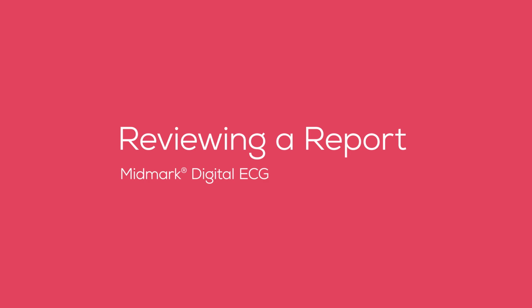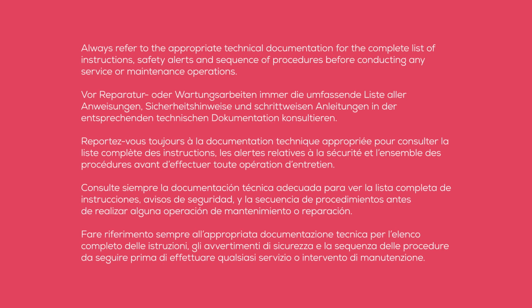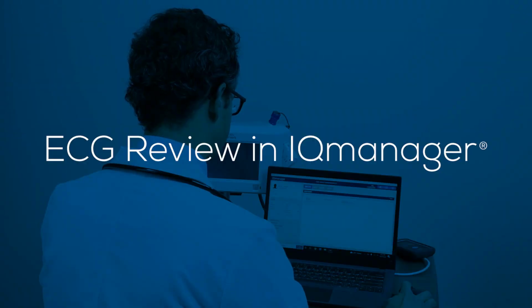This video is an overview of reviewing a report with the Midmark digital ECG. Always refer to the appropriate technical documentation with a complete list of instructions, safety alerts, and sequence of procedures before conducting any service or maintenance operations. ECG Review in IQ Manager.